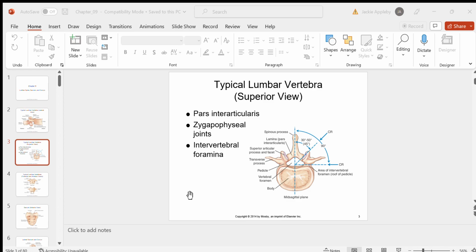Each one kind of diverges a little bit, but you can get a rough idea of rotation because those spinous processes should roughly be midline, and if that patient is rotated at all, they're going to shift just like the articular facets will. On the image, they will be shifted either right or left, apparently, to our view. So these spinous processes help us determine if we are rotated or not. So we use these bony landmarks, and we can't touch them. Well, they are bony landmarks, they're just not topographic, you can't touch them. But we use these landmarks on the body to tell if we are, in some cases, rotated or not.